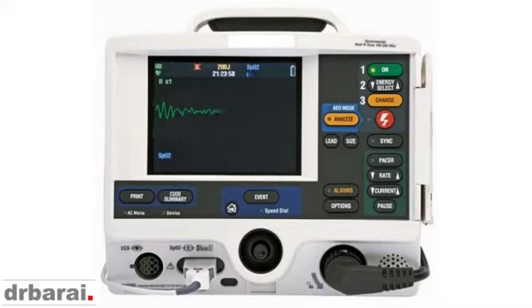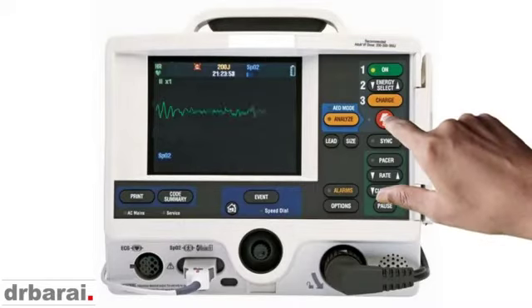It is a wide QRS complex, as you can see here, and it is irregularly irregular. It is a busier looking ECG pattern, and that is called VF or ventricular fibrillation. As you understand from the ACLS algorithm, this is a shockable rhythm. So without any hesitation, we went straight to deliver 200 joule of unsynchronized shock. And he did very well. He got ROSC, went to the cath lab and had 2 stents placed in the coronary arteries, and did very well.